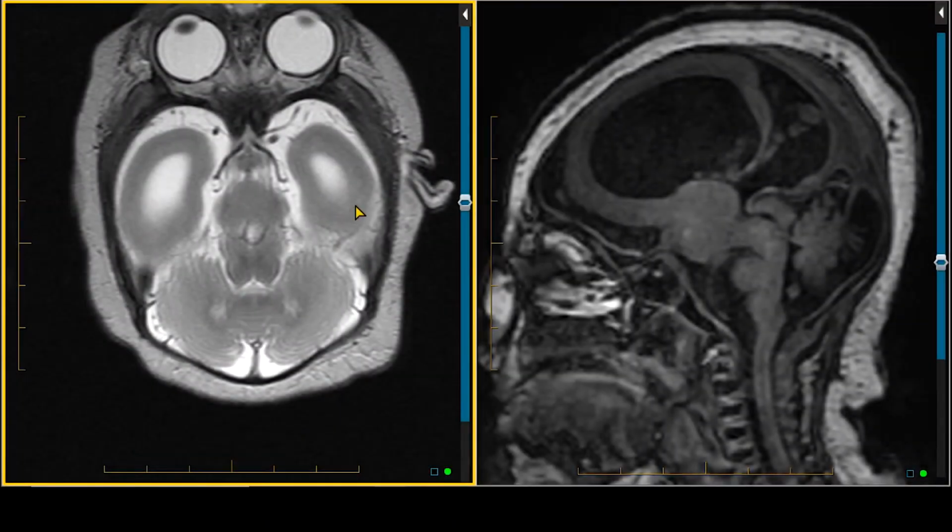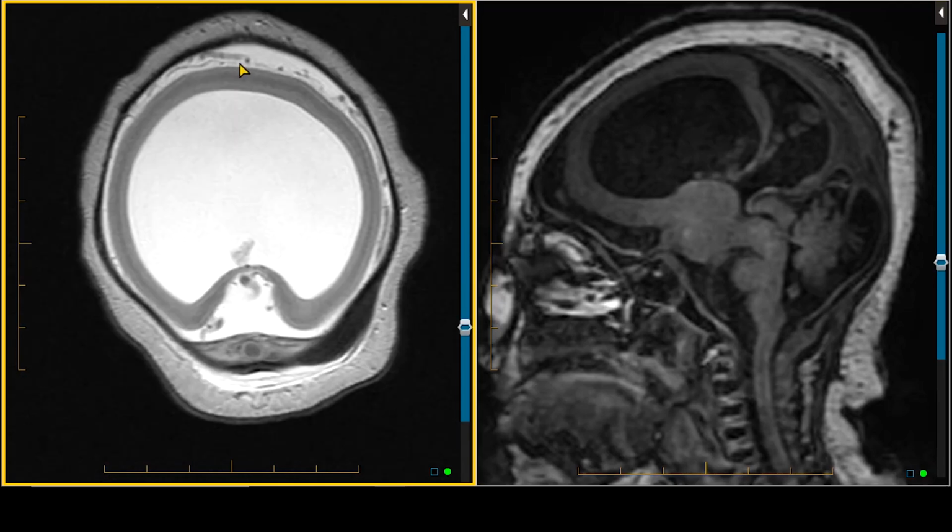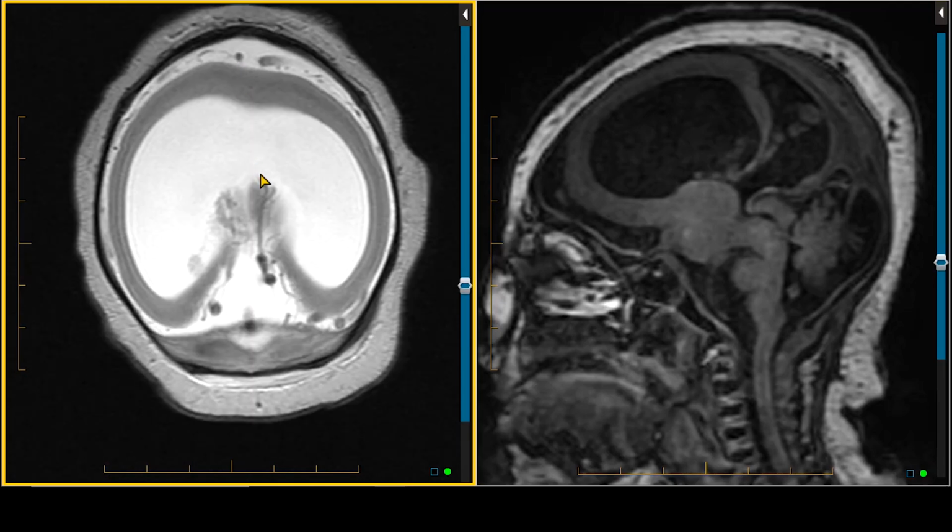This is an MRI of the brain in a newborn, in a child who had an abnormal fetal ultrasound. We can see right away that there's an abnormal configuration of the ventricular system on this T2 weighted image. So there's a monoventricle. There's no two separate lateral ventricles. There's one big, relatively amorphous ventricle. Additionally, we don't have any interhemispheric fissure. The cortex, which is relatively featureless, of one cerebral hemisphere goes all the way over to the contralateral side. We see likely what is a single anterior cerebral artery.